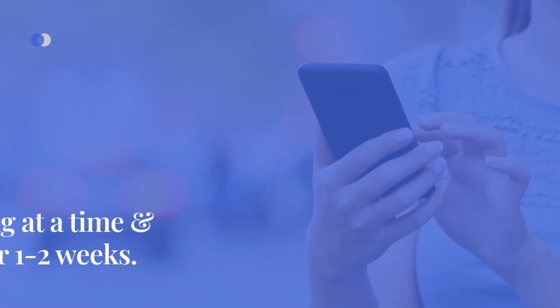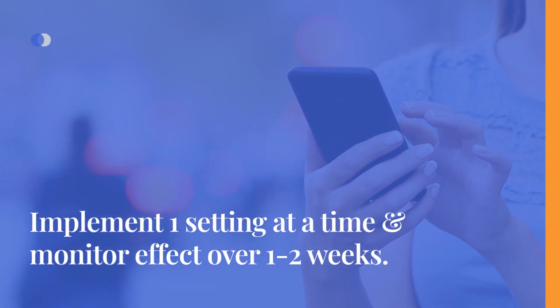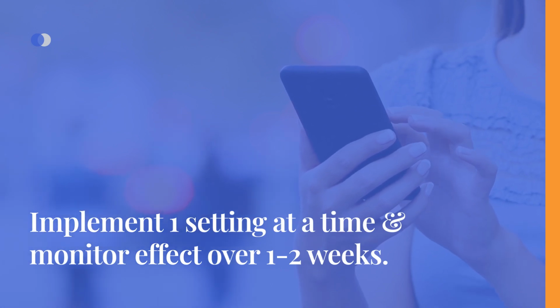When making changes, it is recommended to modify one setting at a time. After implementing a change, closely monitor the effects over a period of 1 to 2 weeks. It is possible that your initial adjustment may not yield the desired results, in which case you can explore alternative options and make further adjustments accordingly. The key is to iterate and fine-tune your settings based on the feedback provided by your Nightscout reports, ensuring optimal performance of your AndroidAPS system.